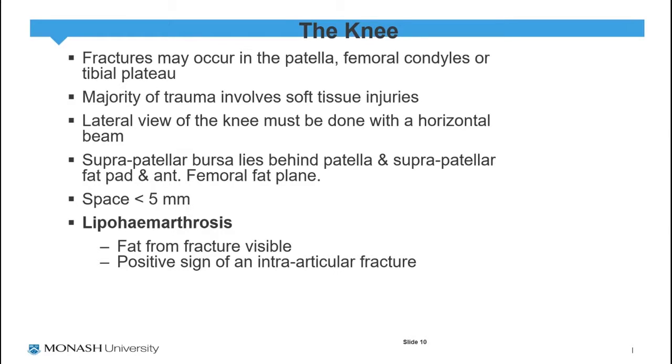Now, the lipohemarthrosis becomes visible as the fat or the lipids from the bone marrow seep out from an intra-articular fracture, and that then rests on top of the hematoma. So if you see lipohemarthrosis, this is a positive sign for an intra-articular fracture.